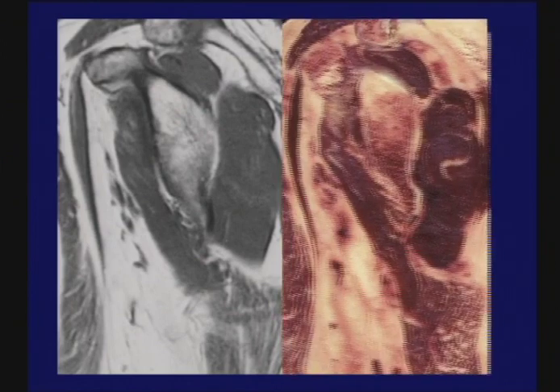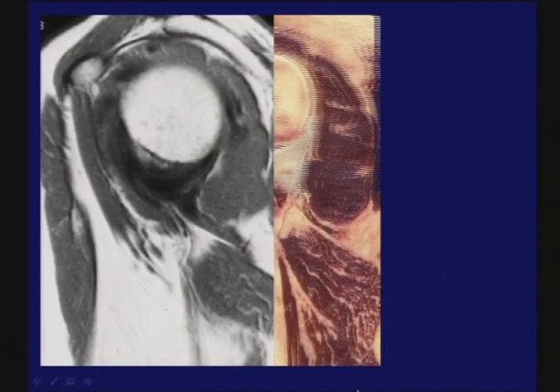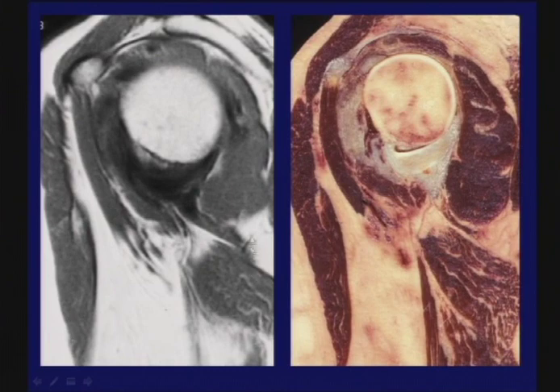But I was very impressed when I looked at that. Here is the second imaging plane in a cadaver, a more medial section: subscapularis, supraspinatus, infraspinatus, teres minor, well shown in the sagittal plane, and then a little more laterally. This was supraspinatus, infraspinatus, teres minor. I want to show you here the biceps sitting in the rotator interval. Well, those look all right.